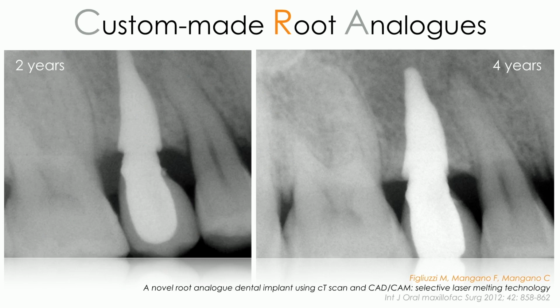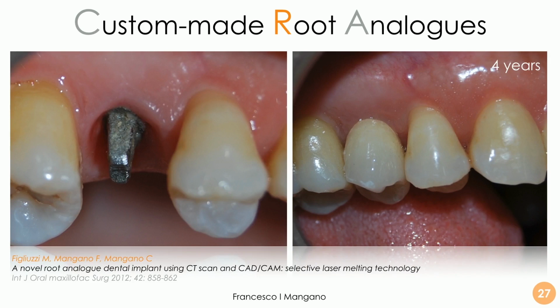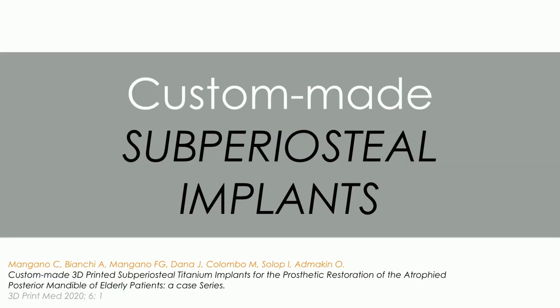And here the follow-up, as we can see, very stable bone level, no issues at all clinically after a long time, and very good integration from the clinical perspective. So it's an option, it's possible through segmentation, a possibility to use DICOM files from cone beam computed tomography. But it's not all. We can also design our subperiosteal implants.